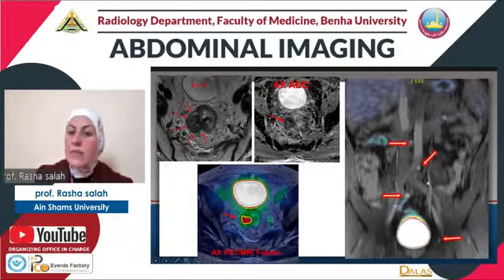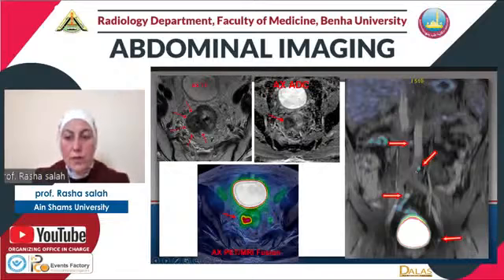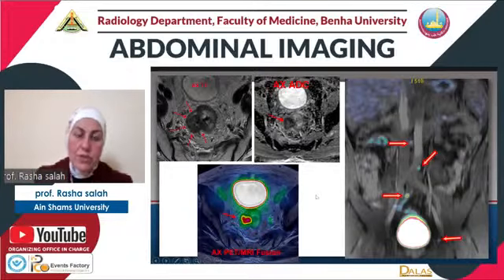And this is the precise evaluation of the distant metastatic lymph nodes at the common iliac and the para-aortic groups. In spite of these lymph nodes being very small in size, and on the conventional images they are non-specific for metastatic lymph nodes, they were proved to be metastatic on the PET component. And this upstaged the patient to metastatic disease.